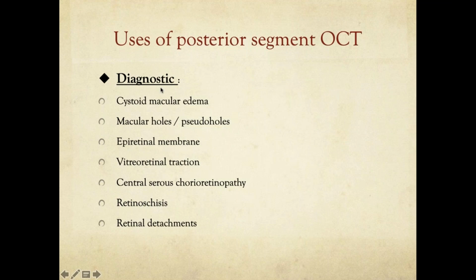But in a patient who has diabetes but is mildly diabetic, does not have very much macular edema, because you did an OCT and found the central macular thickness is around 245, and you want to do a cataract surgery in this patient so that the patient can improve the vision from 6/24 to 6/9 or 6/6, and then you forget to look at the volume, and after doing the cataract surgery, instead of improving the vision, the patient still has a 6/36 or even worse due to increased edema.